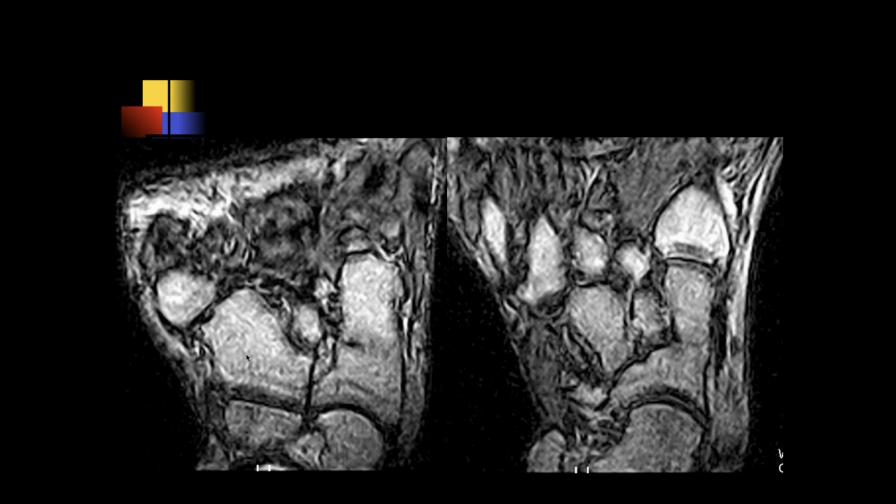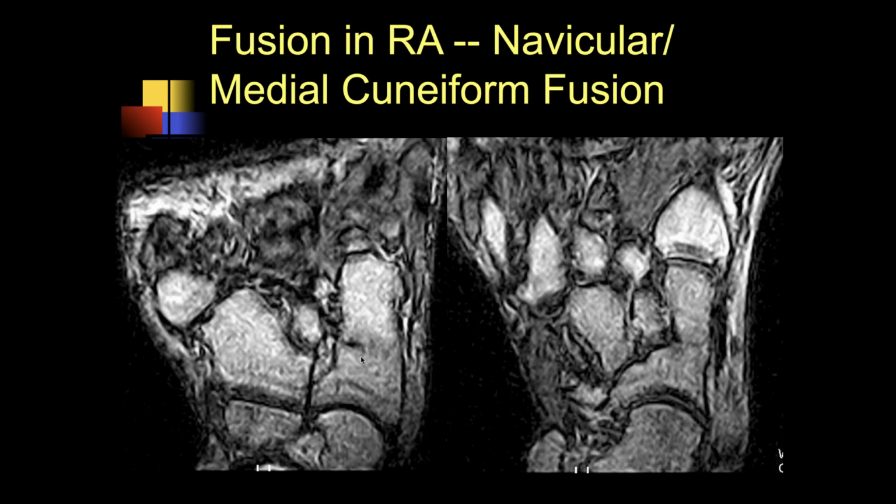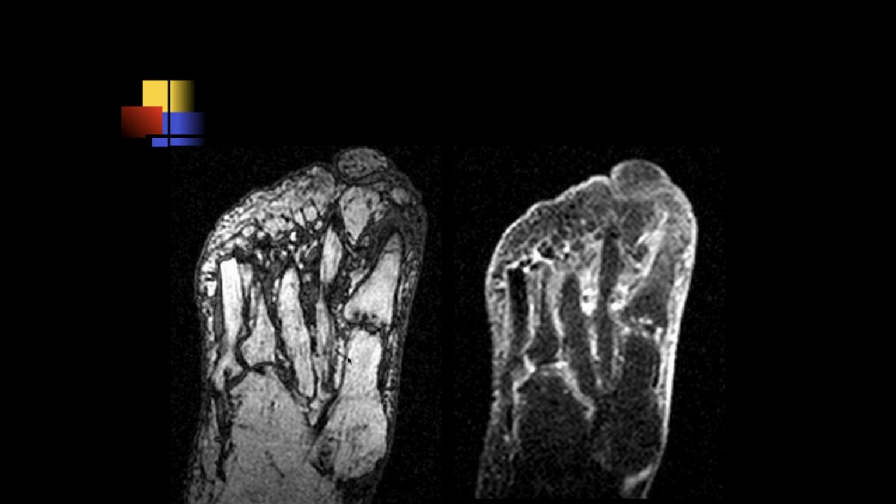Okay, Jennifer. Okay, so here we have some images of the midfoot, and it looks like there is some solid osseous bridging or fusion between the navicular and medial cuneiform. Yep. So I guess this is another fusion. Right, good. Okay, Michael.